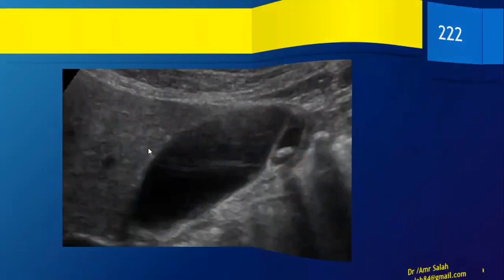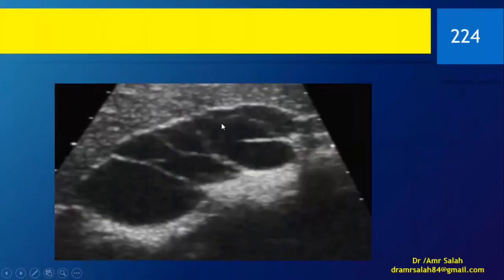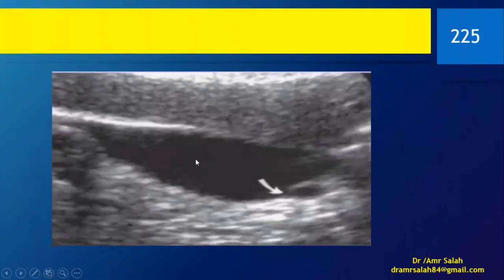Okay. Huh? What about this? Does the patient have stone shadows here? No. It is merely the edge artifact. Okay. This is a trap question. Okay. What about this? The patient has what? Has multiple septi, and this is multiseptated gallbladder, as in the honeycomb appearance. Bravo. Okay. Do we mention that the patient has septum or not? Absolutely correct. Because it is liable for complication, it's worth mentioning.